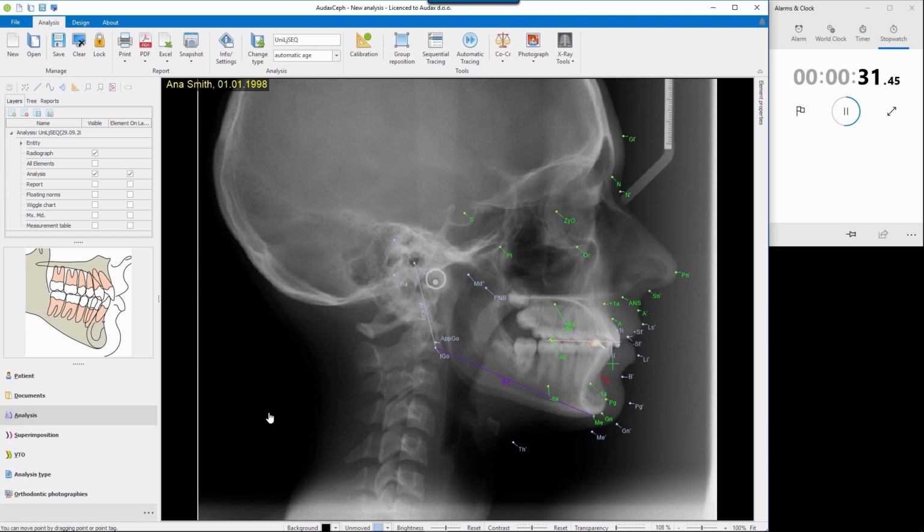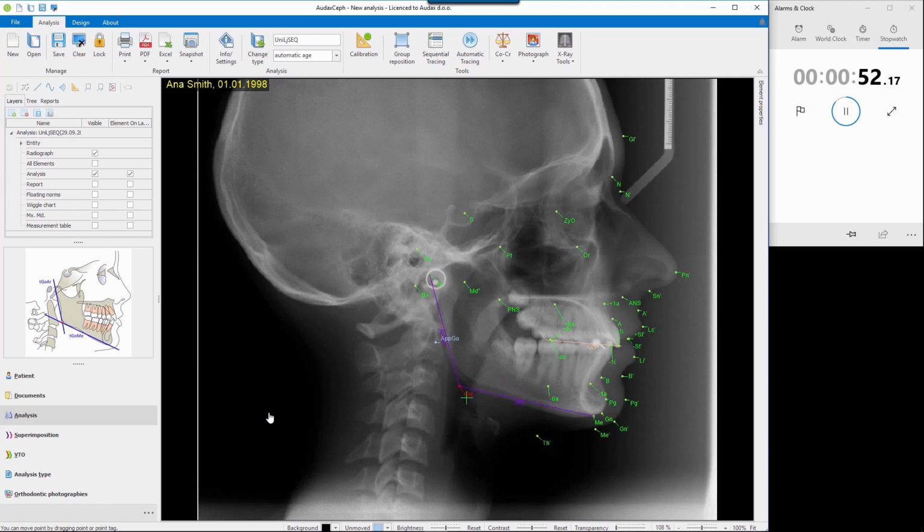So that result is something that I've done before, and that's why I'm really quick. I don't know whether you can do that as quickly, because I'm really doing that automatically. But we'll have some results, and we'll compare those results to the other two ways of tracing. So I have 56 seconds. 56 seconds to do this tracing, and I'm going to remember that.